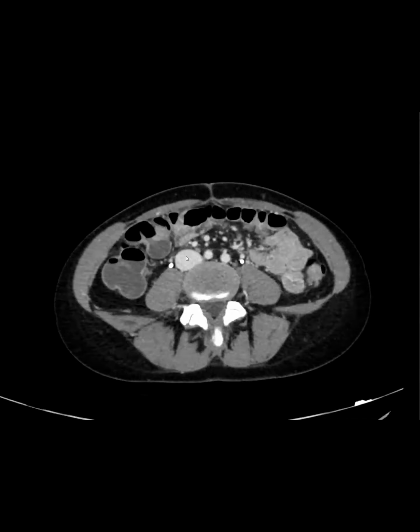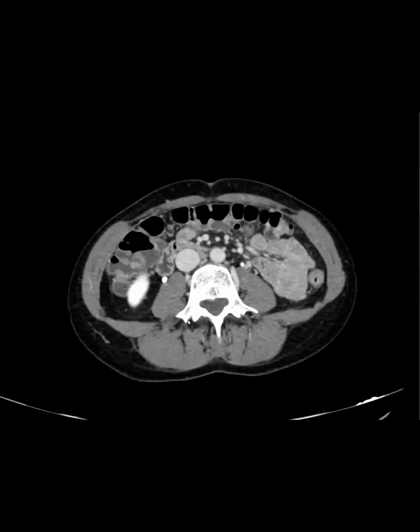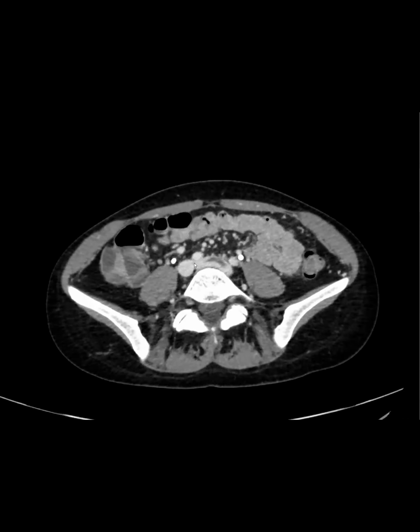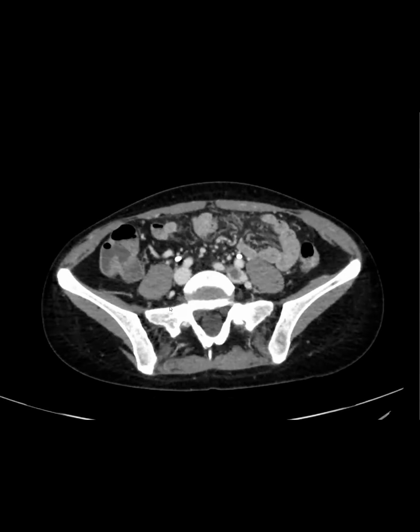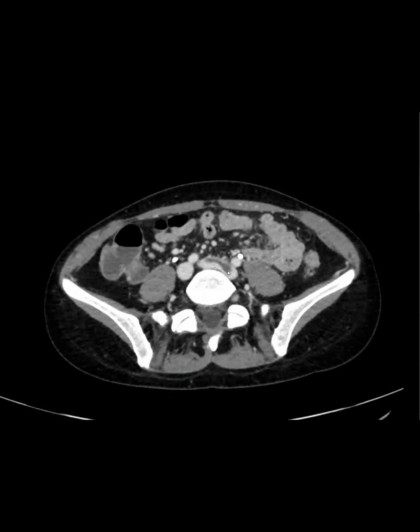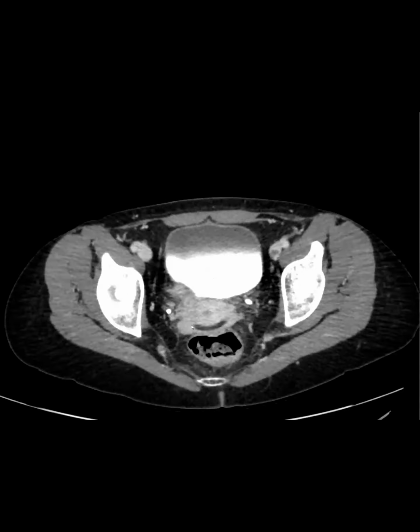The IVC looked pretty good. We did a CT venogram. So for the trainees, this will be around 110 seconds to 2 minutes. And so we can get nice opacification of the IVC and the iliac veins without mixing. And we're seeing this thrombus go all the way up here. So anyone want to give me the diagnosis?